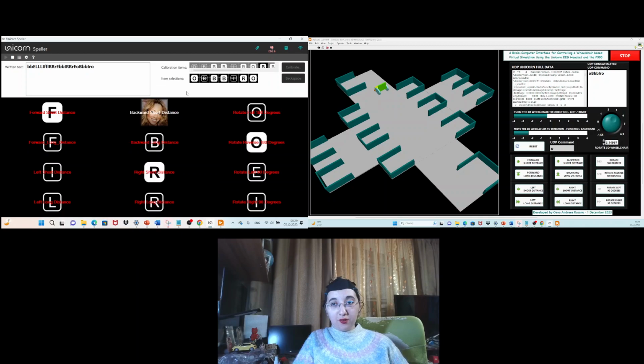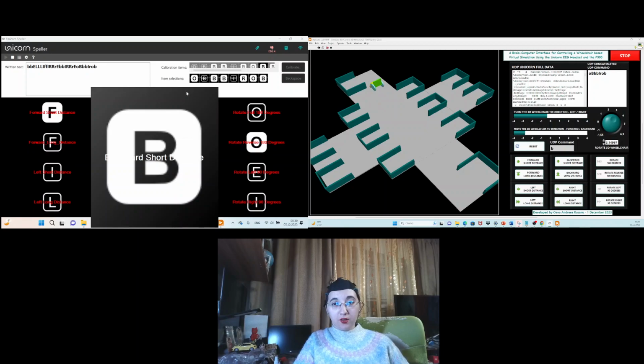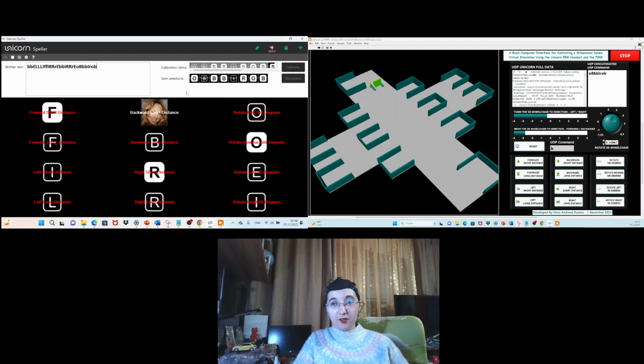Backward short distance. Really nice. Already 8 commands correctly detected.